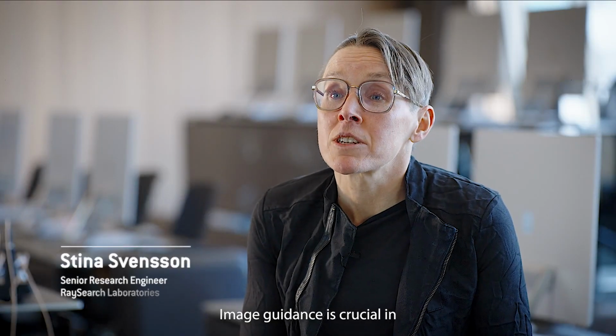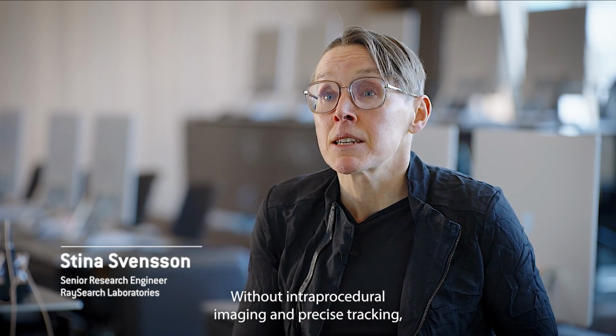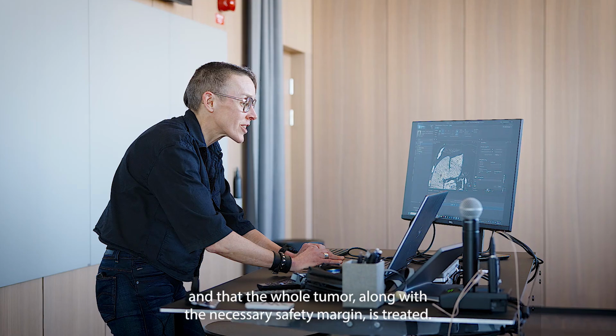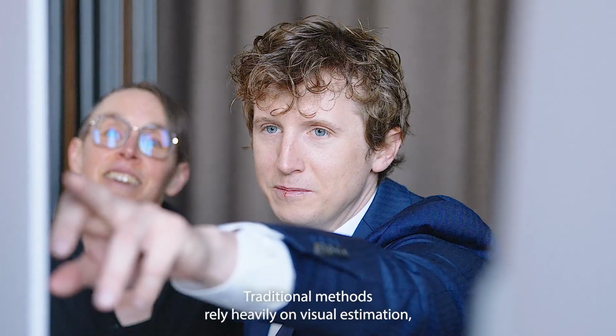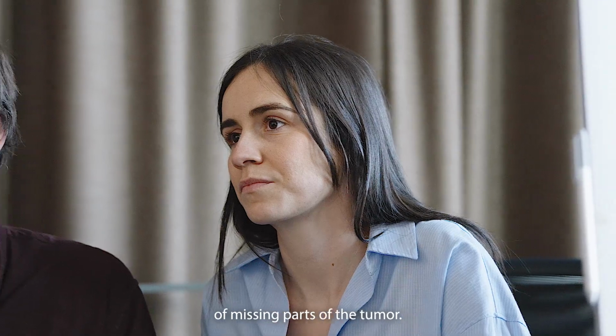Image guidance is crucial in liver ablation because the liver deforms when inserting the applicator. Without intraprocedural imaging and precise tracking, it's challenging to ensure the applicator is placed correctly and that the whole tumor, along with the necessary safety margin, is treated. Traditional methods rely heavily on visual estimation, which increases the risk of missing parts of the tumor.